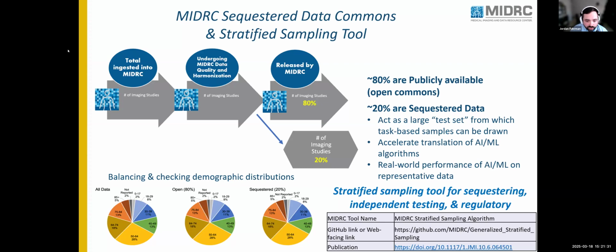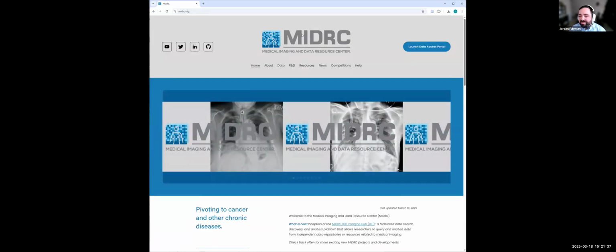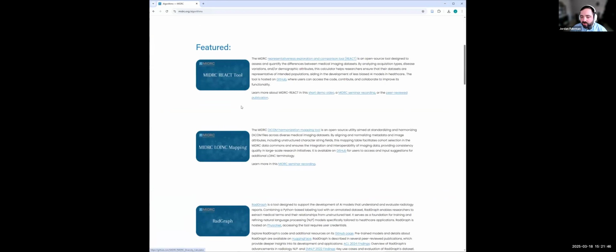Thank you. And for the final tool, we'll go back for the fourth time to the MIDRC homepage and look at resources. This stratified sampling tool is a downloadable tool, and we'll scroll all the way down.